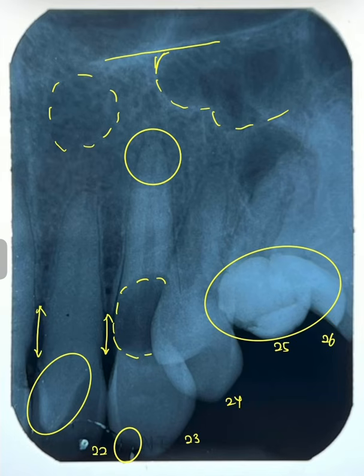dura. And at the apex of 2.5, you can see that there is a well-defined radiolucency around 6 × 4 mm in its greatest diameter. As the apical lesion is greater than 5 mm, the diagnosis for 2.5 is restored with periapical cyst, and the differential diagnosis will be early stage of focal cemento-osseous dysplasia.